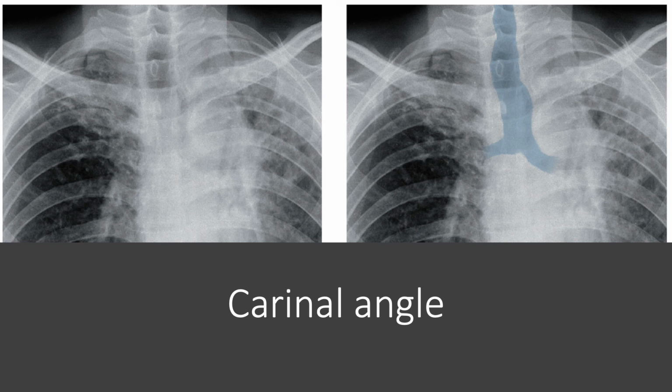Look again at the photo in the slide. These are 2 identical radiographs. The areas shaded in blue are the trachea, the right and left mainstem bronchi. This shows widening of the carinal angle. Possible causes for a widened carinal angle are a subcarinal mass, left atrial enlargement, cardiomegaly or pericardial effusion, or right or left upper lobe collapse, pulling the mainstem bronchus upwards.